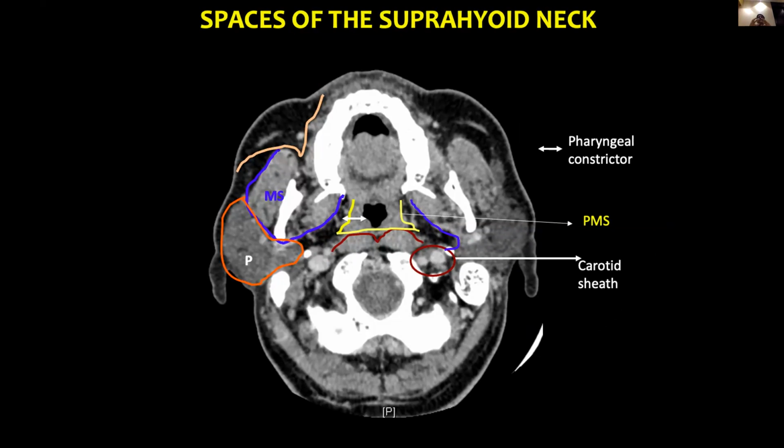So what you can do is, when you ask the patient to do the puff cheek technique, you see some air foci which is running into the parotid gland and along the parotid duct, which tells you that the parotid duct is functional. If it doesn't happen, it might be that it is involved by the submucosal fibrosis or the disease per se, the buccal disease per se.